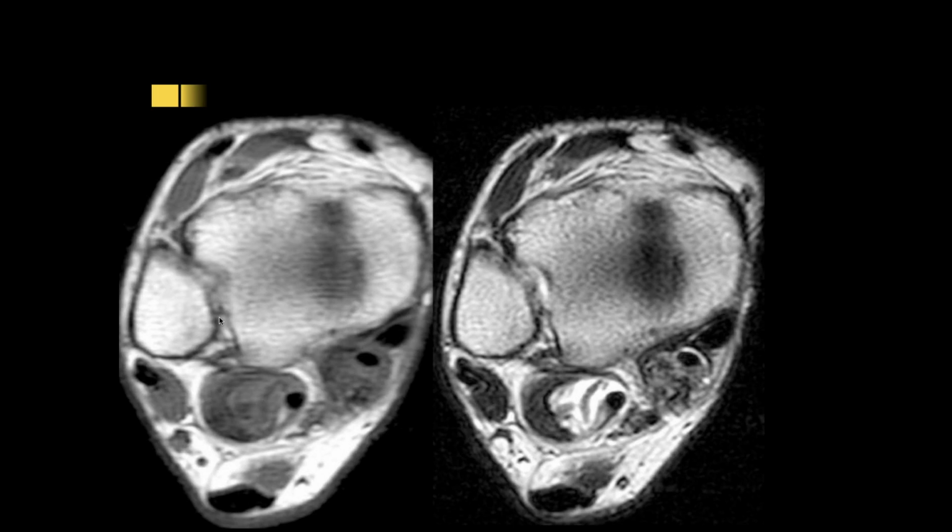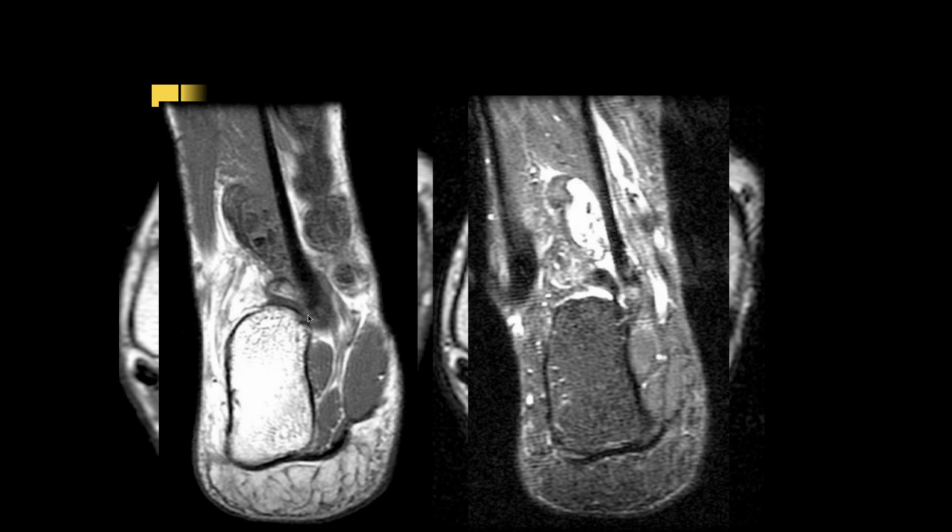Okay, Jennifer. Okay, so here we have two axial images of the ankle, and there's soft tissue signal intensity kind of filling the flexor hallucis longus tendon sheath and the flexor digitorum tendon sheath. There's a lot of soft tissue and also increased fluid signal within the hallucis. So this could also be tophus deposition seen with gout along those flexor tendons, and there's some surrounding soft tissue edema.